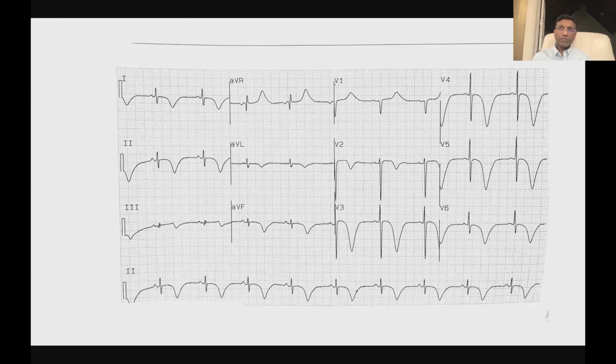You can get pretty dramatic T wave inversions in acute ischemia. I'd give you that. But this one's really diffuse. Look at it, it's in every lead. You have a giant T wave inversion. And what you always need to rule out in this situation is a neurologic cause, like a subarachnoid bleed or something like that, where you would typically see this kind of giant T wave inversion.